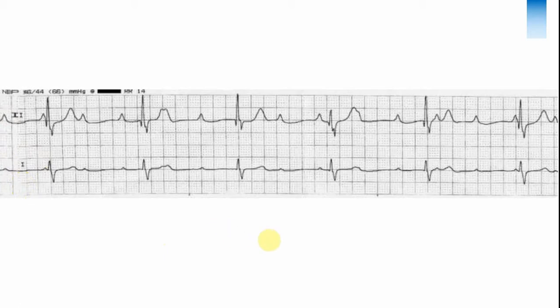So, Becky, would you be happy to interpret this ECG for us? Thank you very much. It is a fantastic ECG, Abhijit. I am going to interpret this ECG in a very systematic way. However, there is an elephant in the room that does not need an introduction. The elephant in the room in this ECG is a heart block. I will come back to it in a second. Let me talk you through the usual stuff at first.